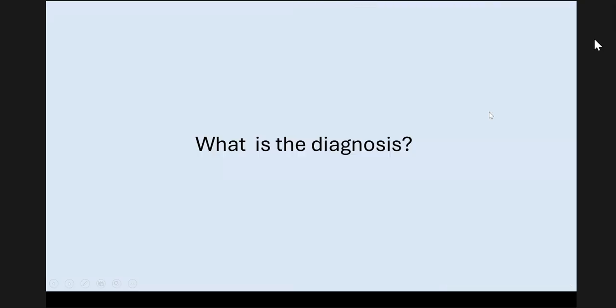And what does that imply? What is the diagnosis? Let's check whether anybody has answered. Yeah, fantastic. A lot of people have come up with the answer.